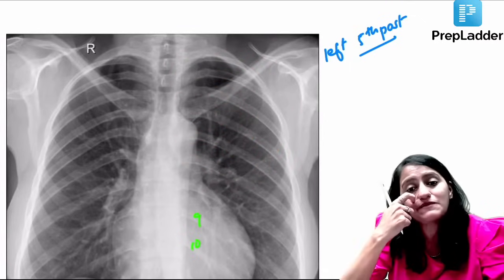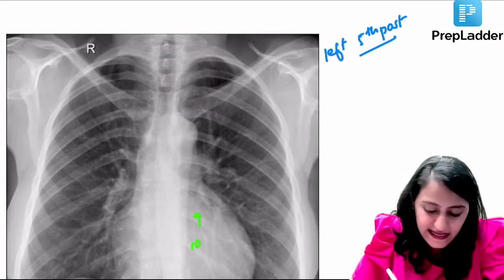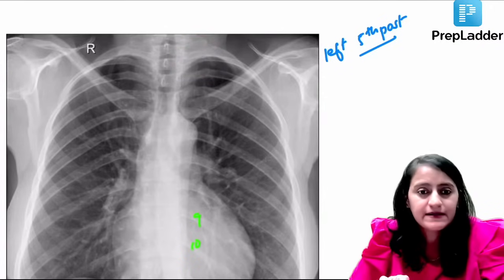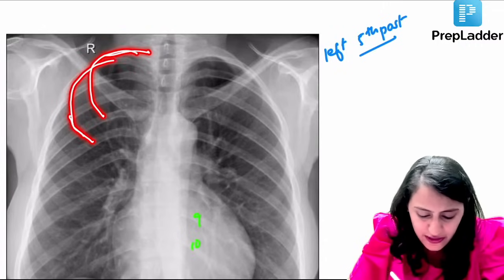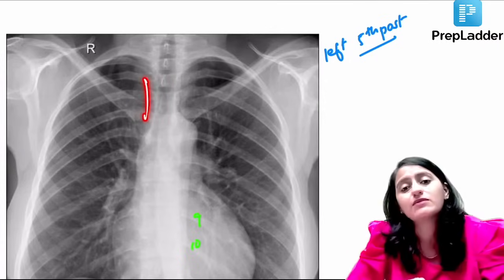You have to pay special attention to the first ribs that you are counting here, because like I said, this is where generally the mistake is made. We count the first and second as one, therefore the mistake happens there. Okay? So that is what you have to be very careful about. This is the first anterior and then the first posterior. This is going to be the second one there, right? Third, fourth, fifth. This is how the counting is going to be.